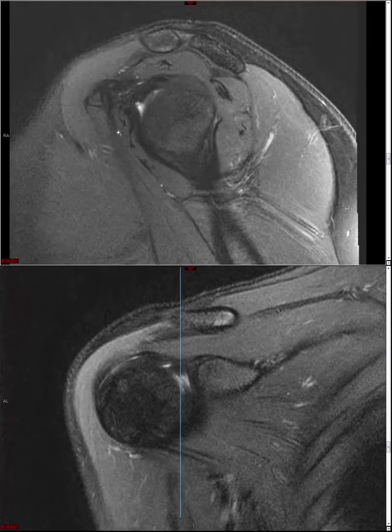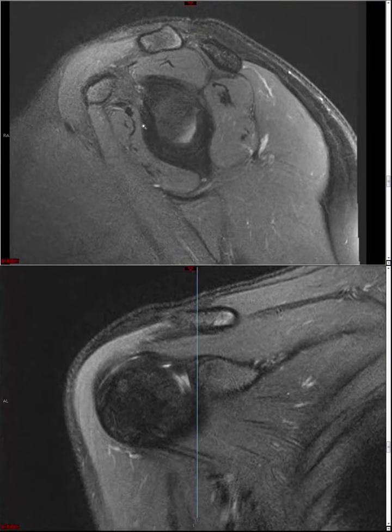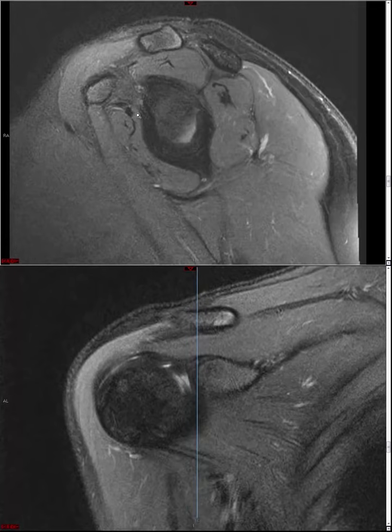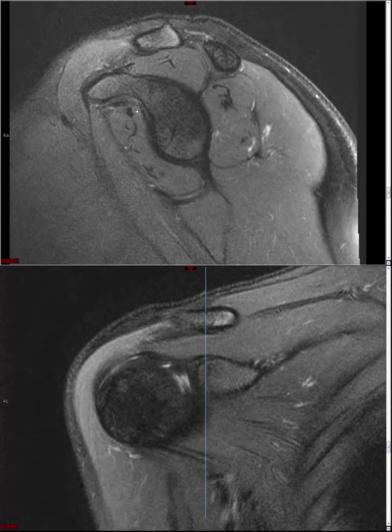So let's say you see fluid that's kind of at the superior margin of subscapularis, and you can see it going up and over the superior margin of subscapularis. That's a good distribution for fluid in the intraarticular subscapularis recess. That should not be confused with fluid directly anterior to the subscapularis muscle, which is fluid in the extraarticular subcoracoid bursa.